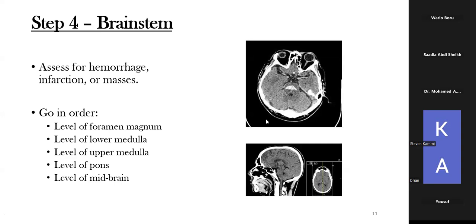Herse is asking, can you give us an example of how to combine all these steps, perhaps in a normal CT image? Okay, so I can attempt to do that. The unfortunate bit is I don't have a scan that shows me all the levels, but I think I've done that as I'm going. So just as an example, I would go through a patient who has got a spontaneous bleed, and the other segments are normal. So I would probably use this as an example.